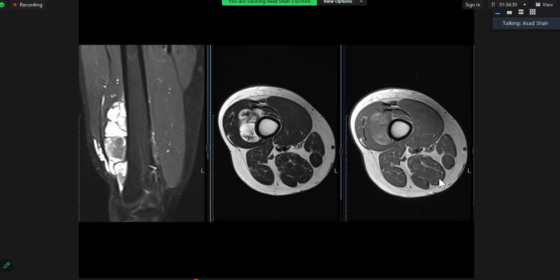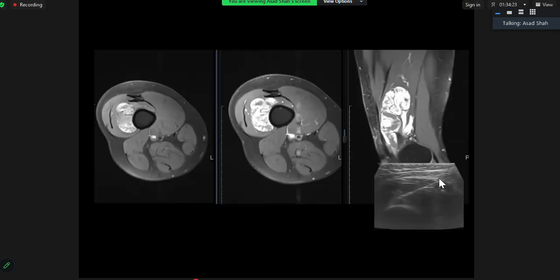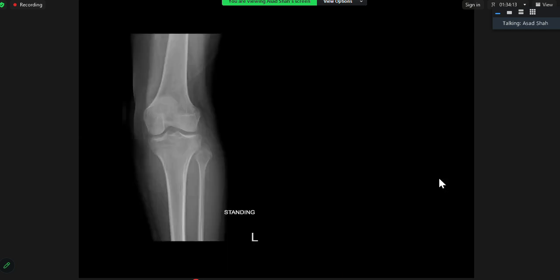Okay, right. Let me show you a companion case to that. So we biopsied this one, and this came back as soft tissue chondromyxoid sarcoma of some sort. Now this one is a 20-year-old lady, and she has got pain and swelling.